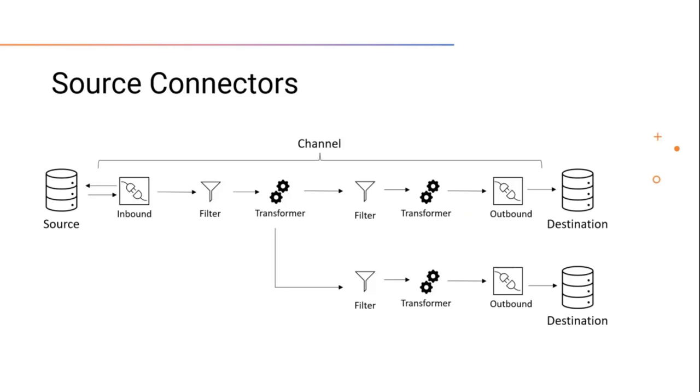Next, we'll be looking at the Source tab and different source connectors we can use. But before we step into the Source tab and look at the different source connectors, let's go over a brief overview of the map Mirth uses when processing a message. Typically, we would use Mirth to retrieve, process, manipulate, and send different messages and message types, as we can see in our diagram. But for this lesson, we'll look at the connection between the sending device and our Mirth server.